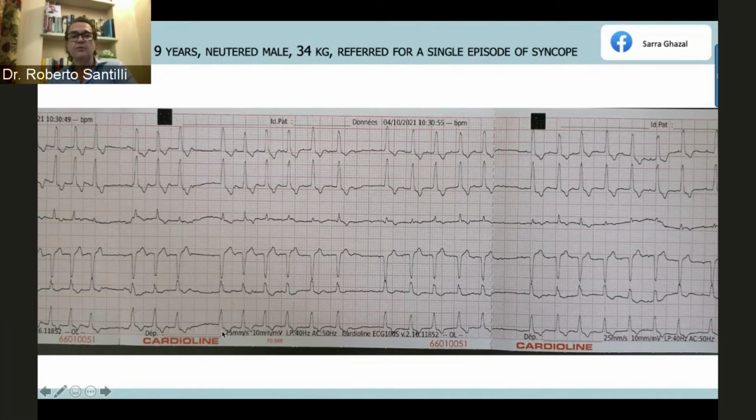Usually the presence of Q waves can suggest the presence of the first vector, so meaning that the two fascicles are working. In this particular case, we don't see Q waves, so it's very likely that the block on the fascicles is before the bifurcation. So we call it truncular left bundle branch block or bifascicular left bundle branch block because two fascicles are involved.